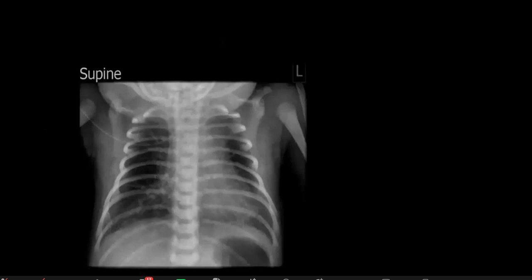Yes, I am. I'm provided with the frontal projection of a skeletally immature neonate in which I can't see any ossification in the humeral ossification center. The lung volumes are increased bilaterally, the lungs appear translucent, and there is mild granularity, which is not very specific.